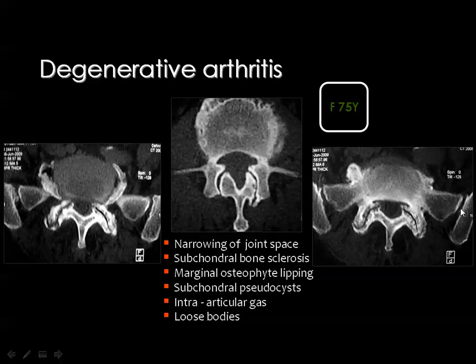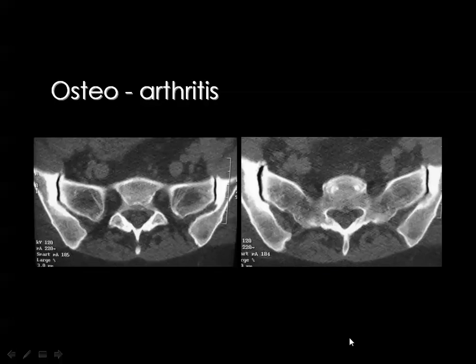And in the second patient, you can see bilateral, almost symmetrical osteoarthritis of the facet joints at L5-S1 level. You know that osteoarthritis of the facet joints in the spine is usually bilateral and symmetric, unless there is a particular cause like scoliosis, like poliomyelitis, for example, and this will lead to the development of osteoarthritis on one side compared to the opposite side.